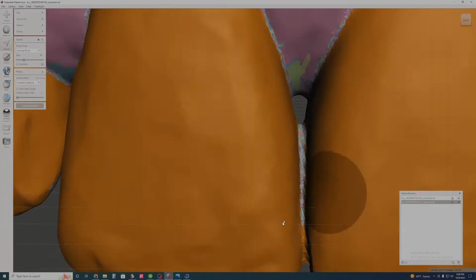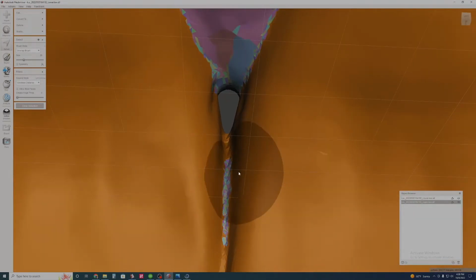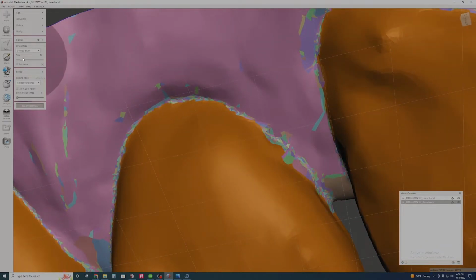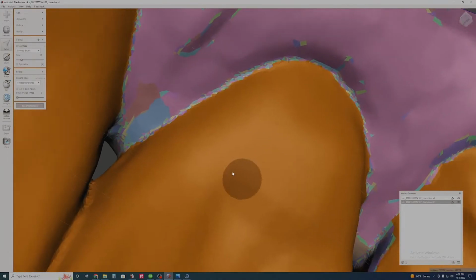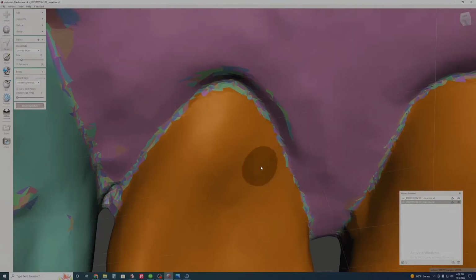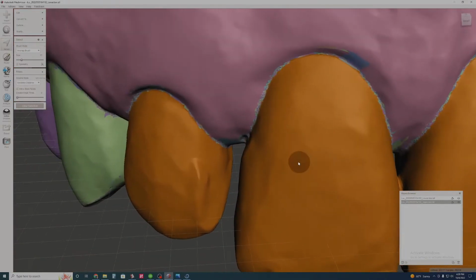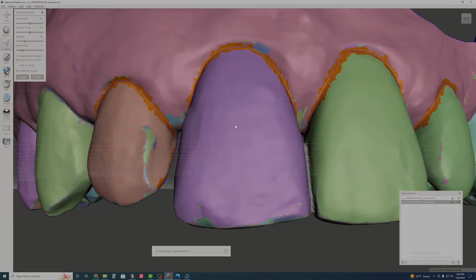I'm really checking for any remnants of areas, like right in here. I don't want anything left over if possible. Otherwise it won't let me smooth the boundaries properly. There's a spot there. I'm going to shrink this down. I'm going to come in and select in this area a little bit. Alright, I'm going to hit my smooth tool, B, and hit enter.